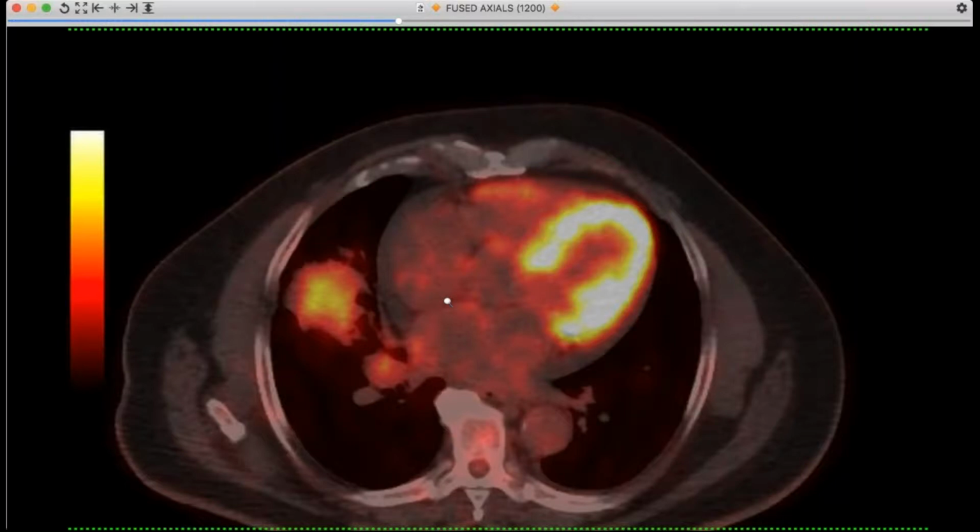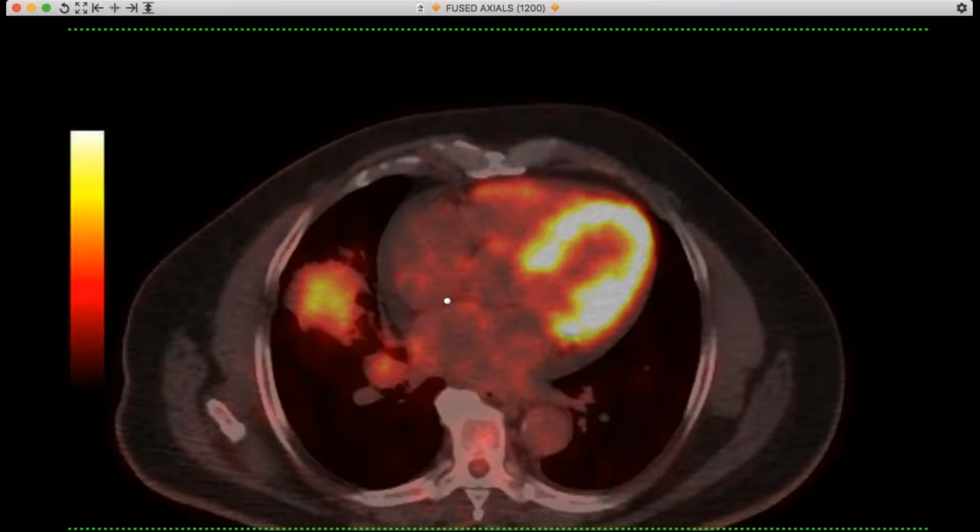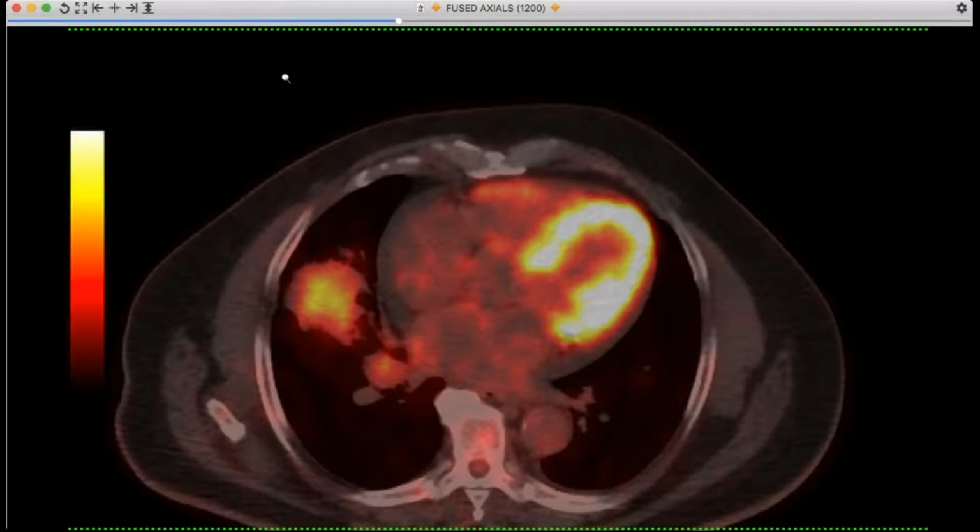It is very odd. I don't know what to make of that. Yeah, because I was asked to review the case, curious if there was anything about it earlier on that screamed malignancy, and not really. Nope. Not until I started really dissecting the images, but even then I still would have favored it being a non-tuberculous mycobacterial process or some other infectious type thing.